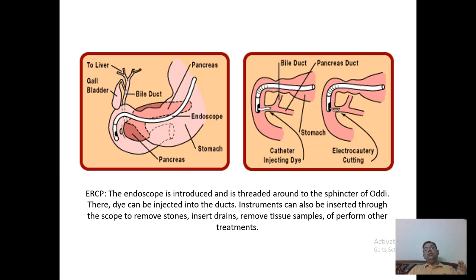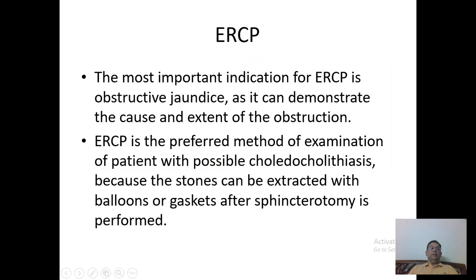Whereas PTC के अंदर इम्कान हो सकता है लिवर के अंदर ब्लीडिंग का, ERCP का काफ़ी हाई चांस है कि ये पेनक्रियाटाइटिस कर दे, क्योंकि आप ये देख रहे हैं जब ये एम्पुला से जाएगा कॉमन पाथवे से, तो it can block the pancreatic duct and result in pancreatitis.